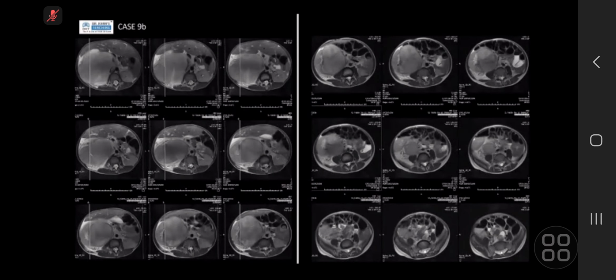Yeah, I think that I would keep the epicenter of the lesion within the kidney and suprarenal gland, and my top differential would be a neuroblastoma. The second differential will be a Wilms tumor. A third differential, which is much less likely, would be a large necrotic lymph node. And I would like to inform my findings to the referring physician.